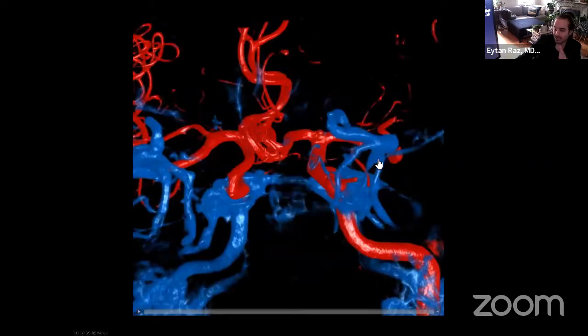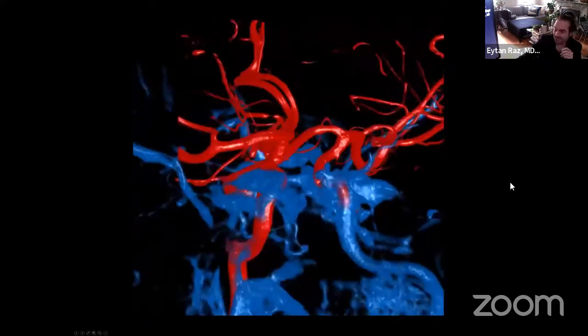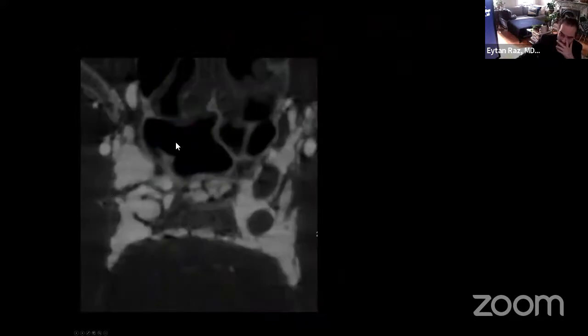In this case, it is a fusion, and what these images show, when you start looking at the cross sectional, you understand things much better, because you see this is the right side, this is an axial view, this is the carotid, and now you see the hole, right? Look at this. This is the hole. This is the tear of the vessel. So you understand very well which compartment you may need to close, right?